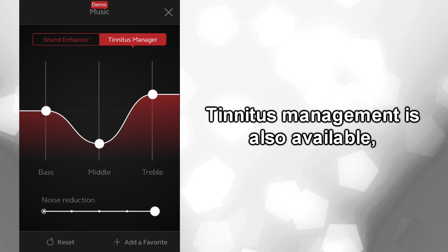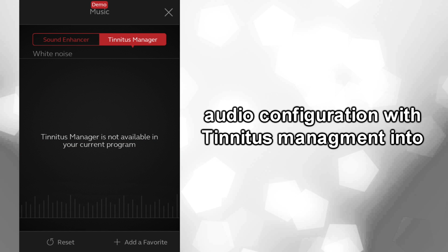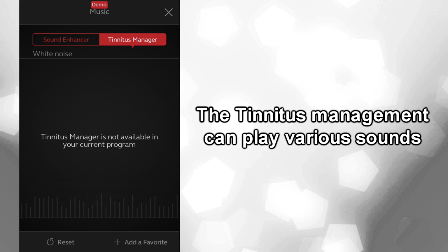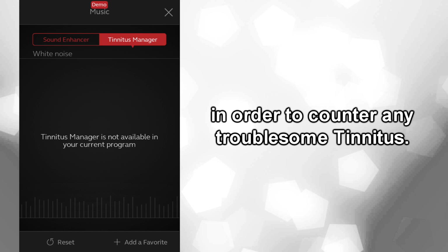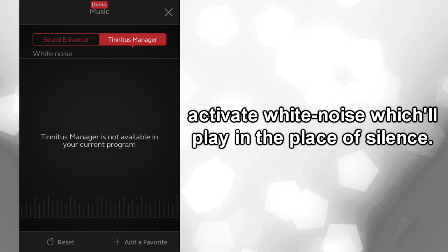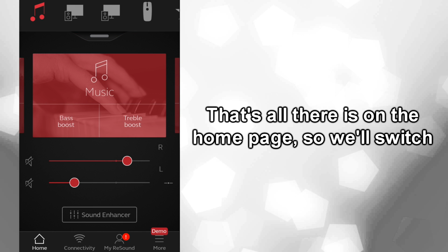Tinnitus Management is also available, and I'm pleased to see a manufacturer has combined audio configuration with Tinnitus Management into one single application. The Tinnitus Management will play various sounds in order to counter any troublesome tinnitus. For example, in quiet rooms, tinnitus sufferers can activate white noise, which will play in the place of silence. That's all there is on the homepage, so we'll switch across to connectivity.